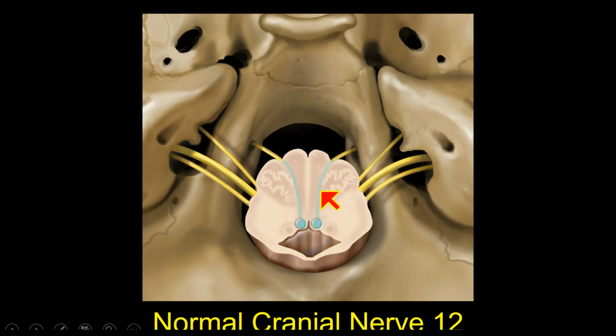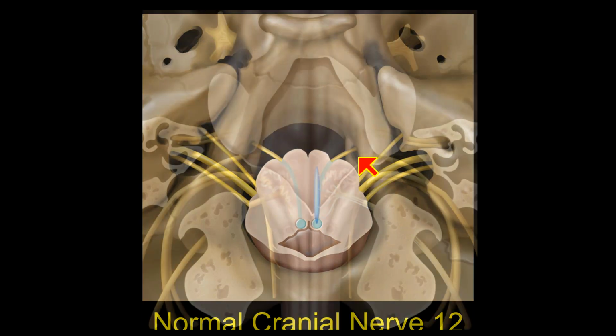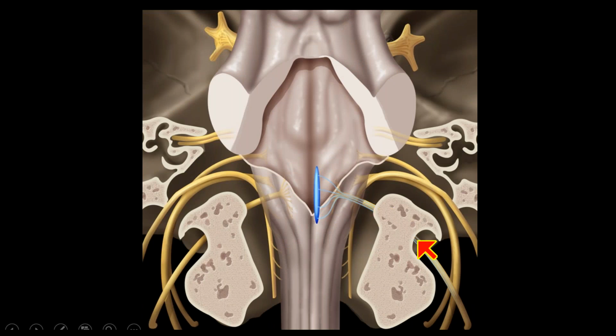So the nucleus is in the back, and we have an intraaxial segment, just like all the other cranial nerves. Then we have a small cisternal segment that goes over to the hypoglossal canal. And in the coronal plane, again, we remember where that branchial motor nucleus is and all those fibers that come out under the beak of the bird in the coronal plane. So 9, 10, and 11, jugular foramen over the top, and 12 under the beak of the bird below.